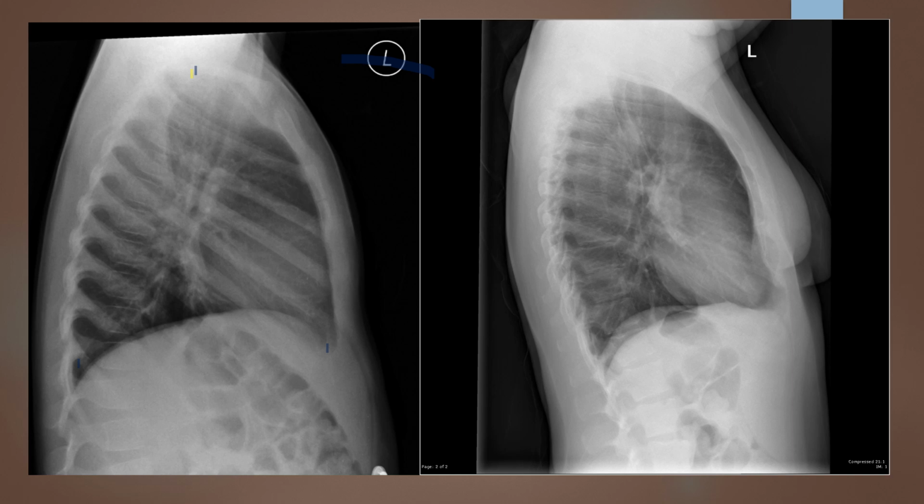So do I have penetration of the diaphragm? Do I have soft tissue detail, bony trabecular pattern, good cortical outline? And I would say, yes, I really do have all of those things. Do I have a long enough grayscale to give me good lung markings? And it looks like overall, yes. So technique-wise, we look okay. Anatomy-wise, we look okay. Legality-wise, we look okay, except for this digital marker.